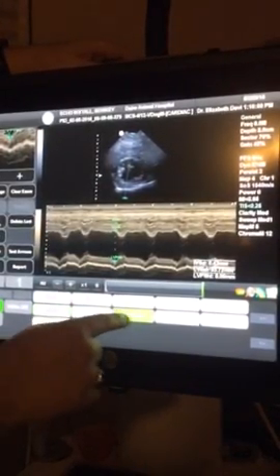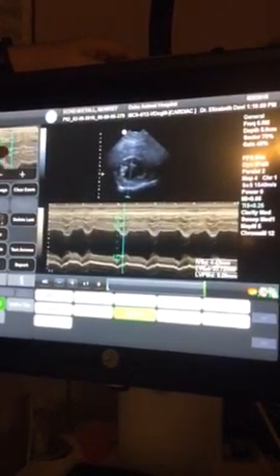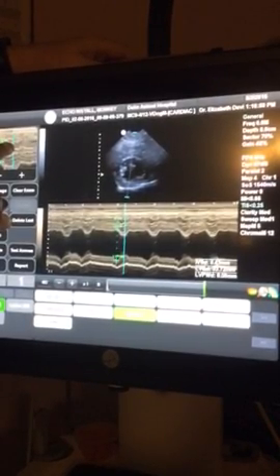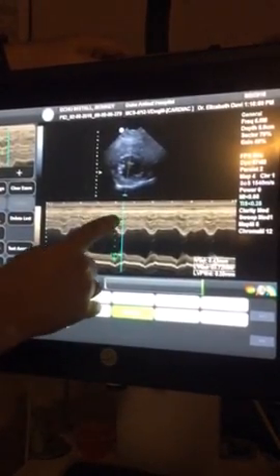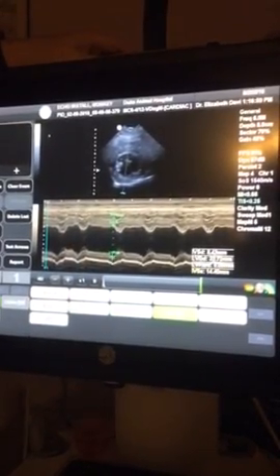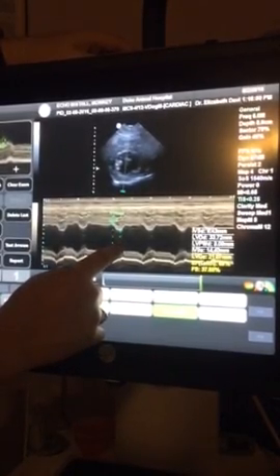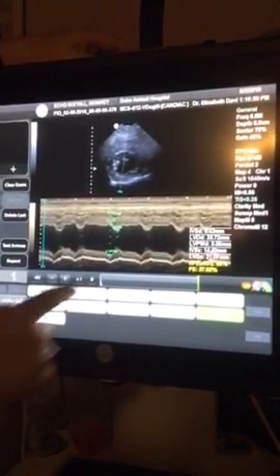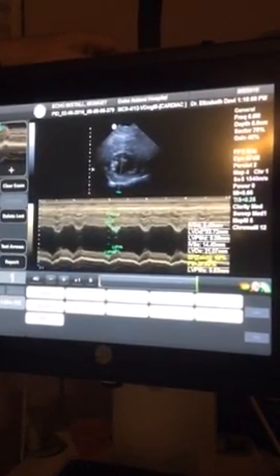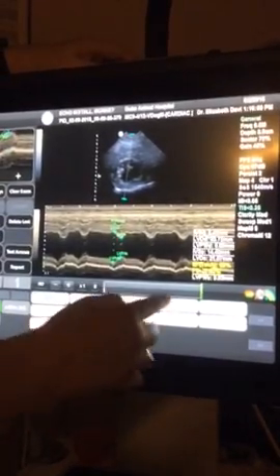So now we're going to go to IVSS. We're going to look where our humps kiss in the middle. We're going to go to the top of our wall. We're going to move our line a little bit to the right where it's over the humps. We're going to touch and drag the thickness of that one. So now we're in systole. We're going to bring it down to the top of our hump here. Okay, and then once again down to the white line. At that time you do want to hit number 1, because that'll lock each measurement in.